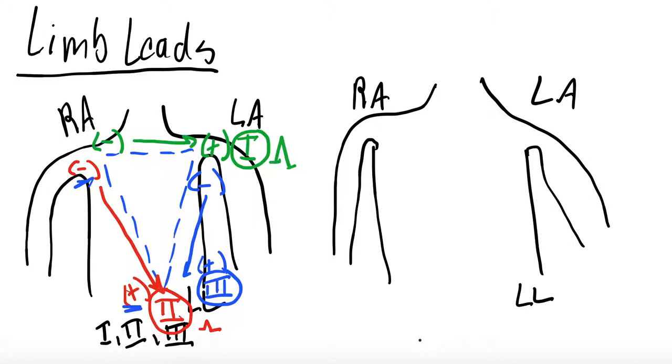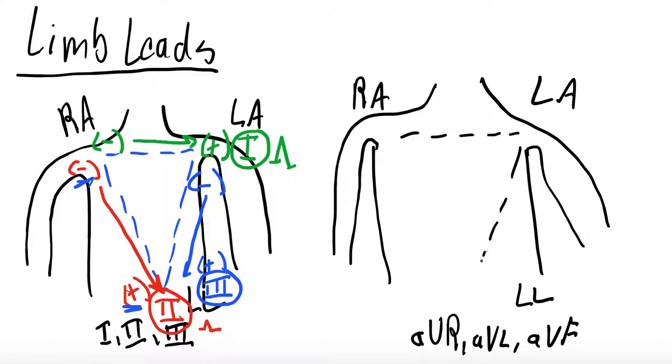Okay, so then same thing for the unipolar leads. The unipolar leads are aVR, aVL, aVF. They're called unipolar leads because, unlike the bipolar leads, they don't have a firm preset positive and negative electrode spot. They use the middle area of the other two leads as the negative and positive. I know that sounds confusing, but bear with me here and I'll show you what I mean.